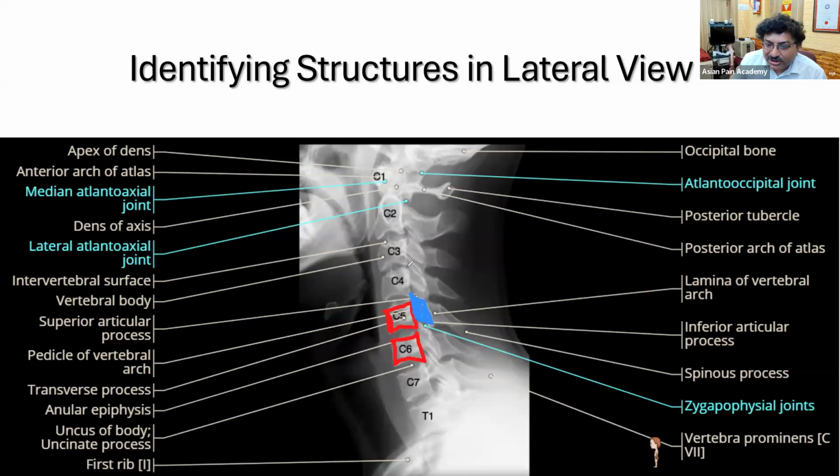Please. Here is also one rhomboid shaped. Pedicle? No. Transverse process? These are not pedicle, not transverse process. Lamina? Superior articular? No, it is not the lamina. So look at here. Facet joints. See the yes. Okay, so these are the rhomboid shaped. Superior articular process. Okay, so these are the facet joints.